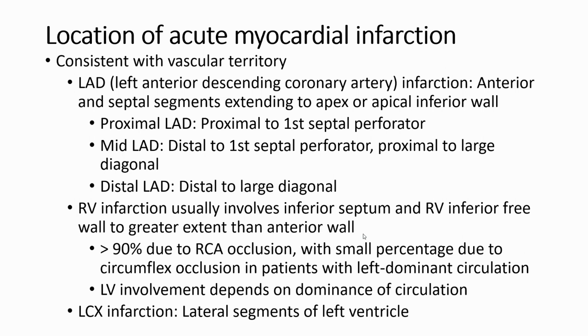It starts proximal to the first septal perforator. Mid left anterior descending coronary artery starts distal to the first septal perforator, proximal to the large diagonal. Distal left anterior descending coronary artery starts distal to the large diagonal.